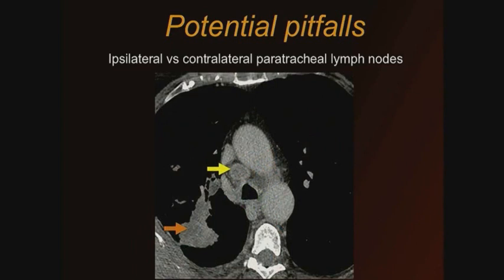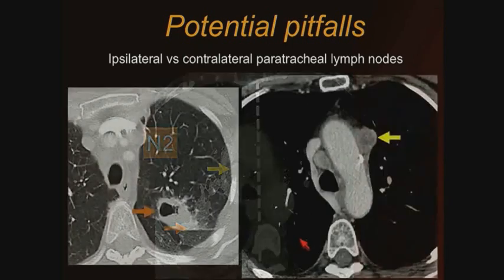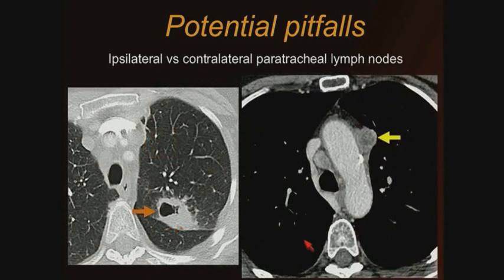This really becomes important for lymph nodes that fall anterior to the trachea, because as we know, we don't have a pretracheal nodal station. So one of the most important modifications of this map was the definition of an anatomic landmark, and we're using the left lateral wall of the trachea to define right versus left. So in this case, we have a patient with a right apical tumor. This pretracheal lymphadenopathy falls into a right or ipsilateral lymphadenopathy, and this patient is classified with N2 disease.